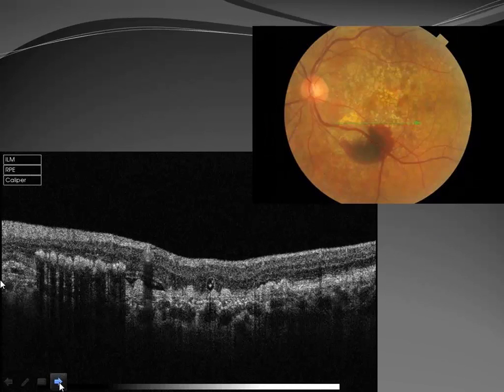I'm just trying to find one specific slide if we could. So here we're taking different cross sections. Here we have one. So here's a horizontal slice through this stuff over here. And if you notice, you may have not, but these white spots weren't here before in that last image. So here's bleeding, of course. And we think these are actually exudates. These are drusen, these are exudates.